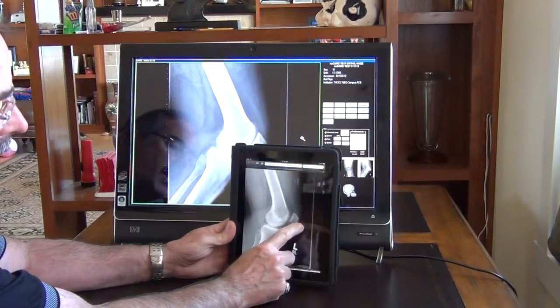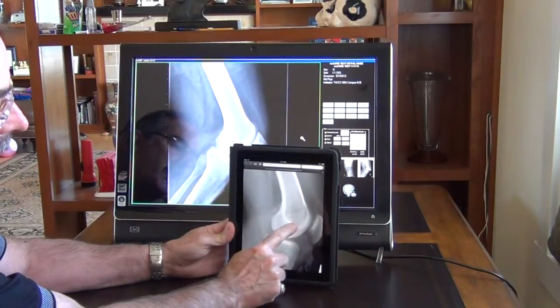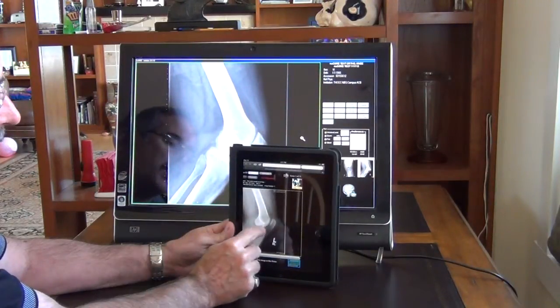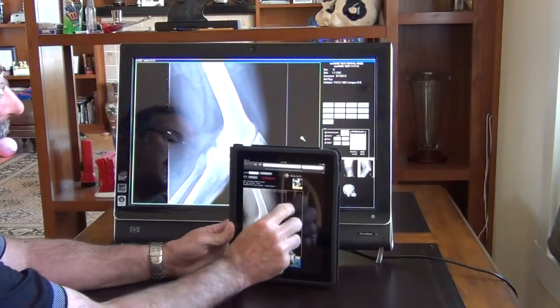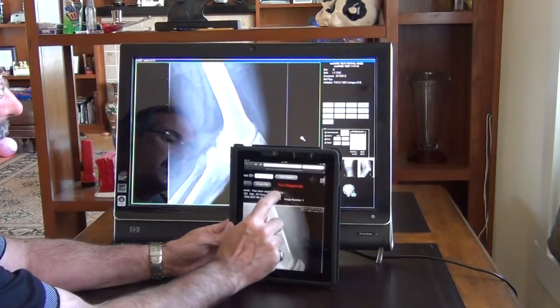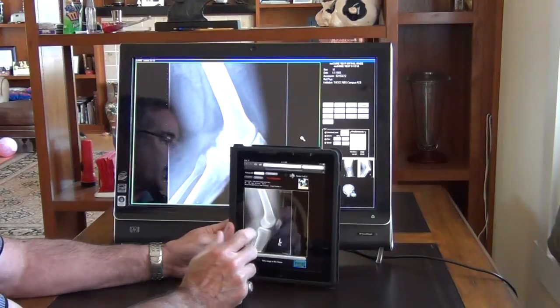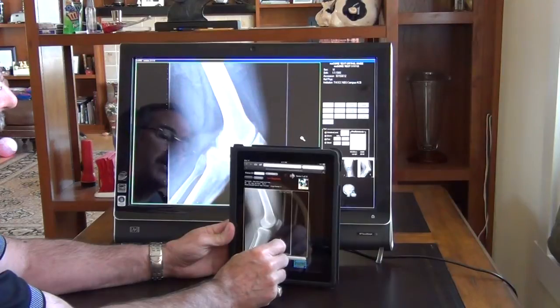With the iPad, I have certain functionality, I should say, that allows me to magnify and pan. Let's also notice that we didn't download just one image, we actually downloaded 11 images. These are JPEG images. The screen reminds us that they are not diagnostic quality, but they are excellent and readily available for another quick review or to share with a referring physician or even the patient.